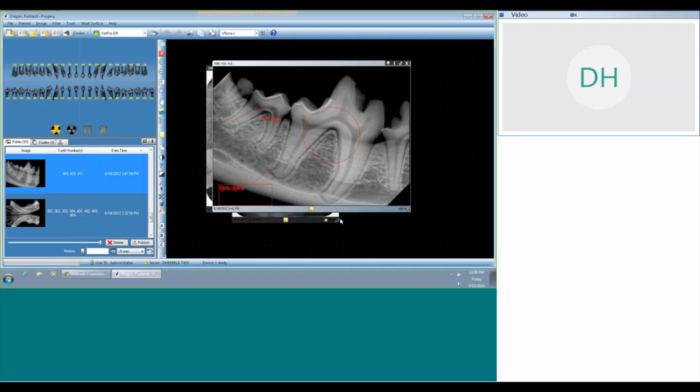Now, if I want to get rid of those annotations, all I need to do is make sure that I'm in that window. I click on the ruler, then I can come over here and click on whichever one I want to delete. Once it's highlighted like this, I'm going to hit delete. Now these will take the annotations away. If I leave them on, they will be printed. If you're printing, the images are going to be printed out on the handout.